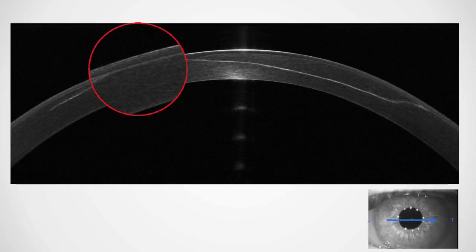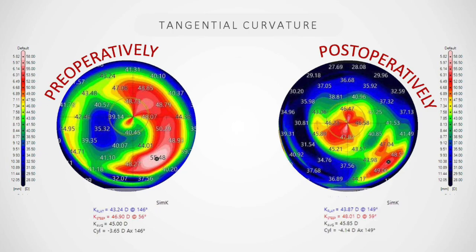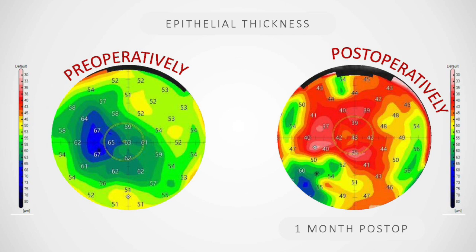OCT sections, as I said, don't look at just one, always rotate and look at everything. This is a flap, and if you're thinking to relift because the patient did LASIK somewhere else, think twice, look at all the sections. This is the section 90 degrees away, and that's it. Even here, the flap went in, that was a buttonhole before, and if you keep looking, there was also a PRK treatment on top because Bowman's layer is not there. We ended up doing transepithelial PRK for the patient. We kept the astigmatism and treated only higher order aberrations. This is the first month. The epithelium is much more regular than all the acrobatics it was doing.